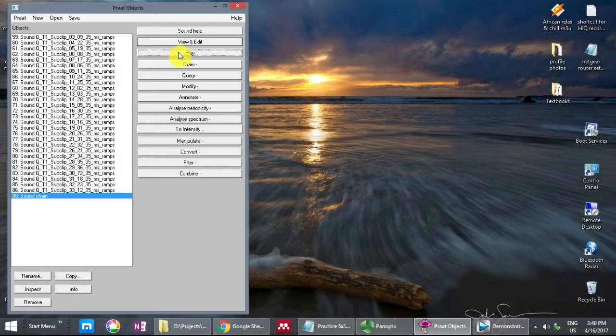So that's where we'll wrap up this video. The next step, of course, will be to name all of those files according to the convention specified in the ICRA documents.